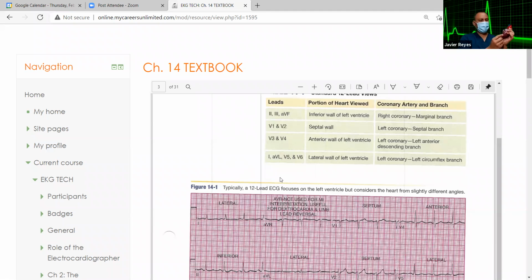And which arteries are affected? Which ones did we just say feed both ventricles? The right coronary and the marginal arteries. So instead of saying the arteries must be occluded over here, well, no, in this case, the right marginal arteries are the ones that feed both ventricles. So it even tells you which ones.